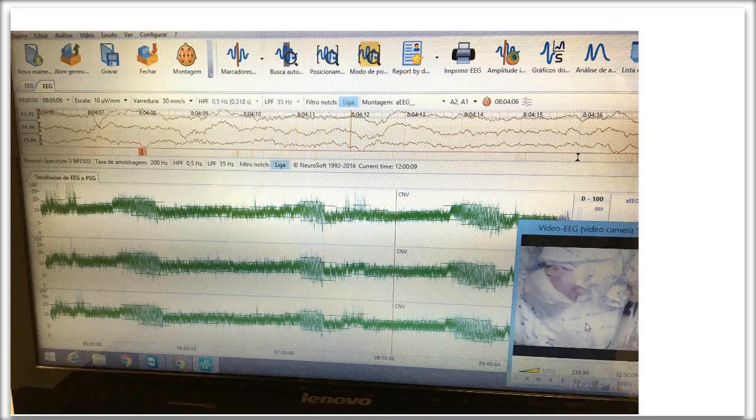And one of the things that he was remarking on about this tracing, he's noting that the MRI is normal, so that's excellent. And I think the first thing we all notice right away is that there is a very narrowness of the aEEG band, but certainly there is still periods of alternating patterns between kind of continuous and not even maybe quite discontinuous, but certainly showing these periods of widening of the tracing.